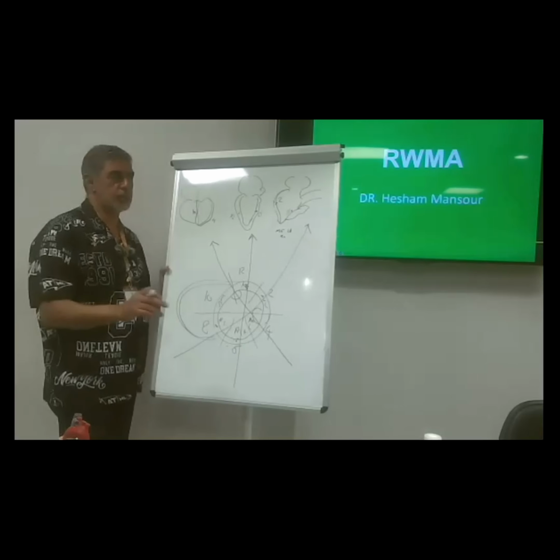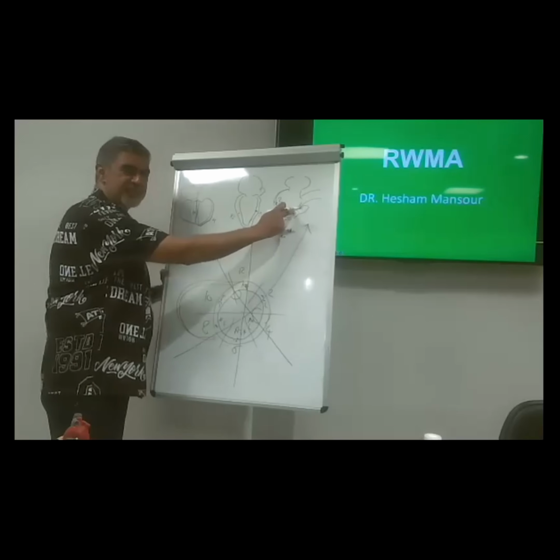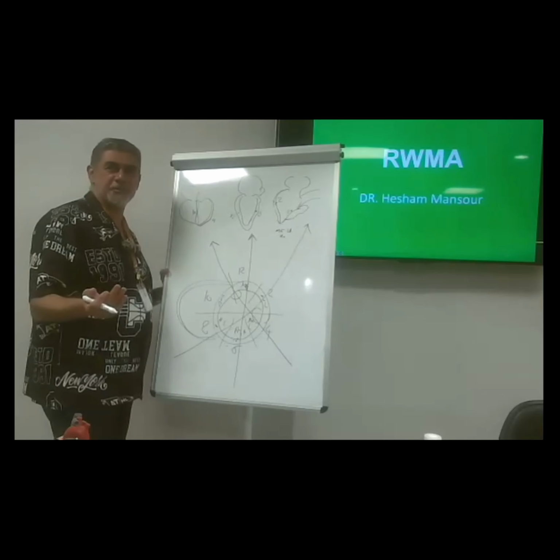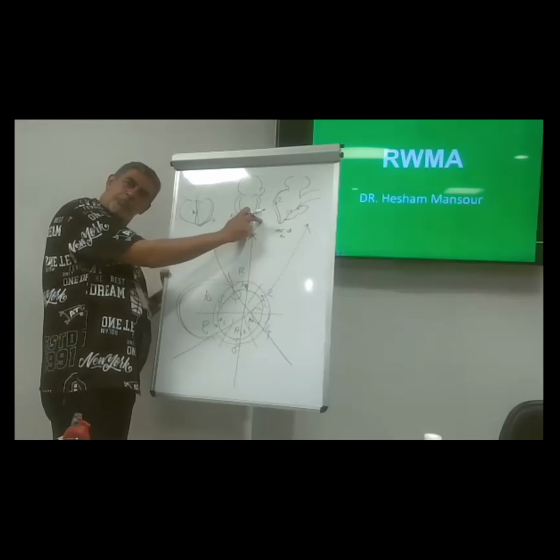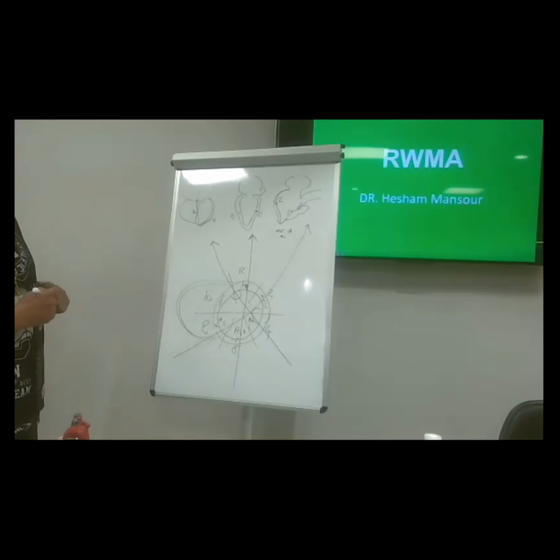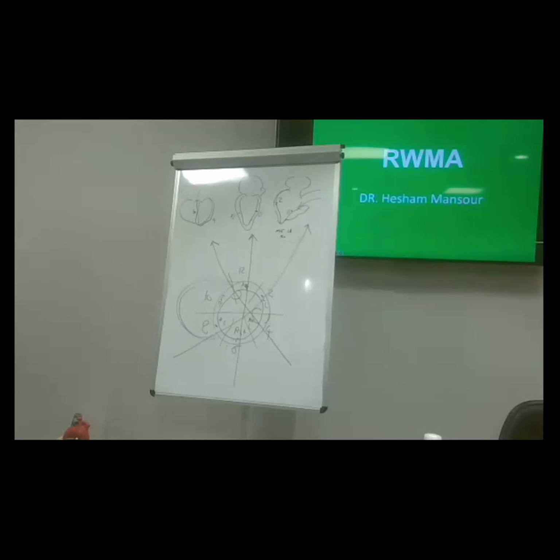Again, what's the name of this wall? Excellent. What's this? No, high, loud. You ask me to be loud. Okay. I didn't mention this one.